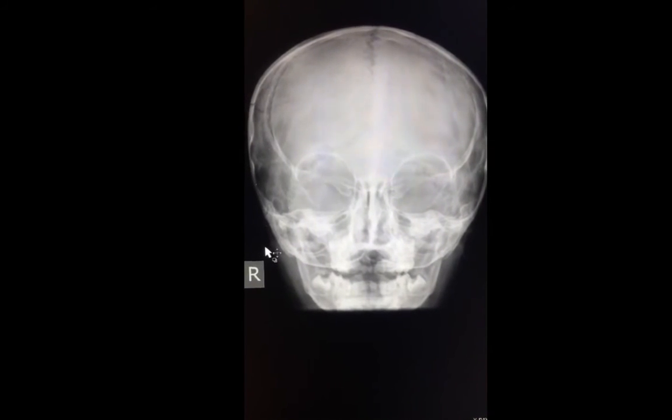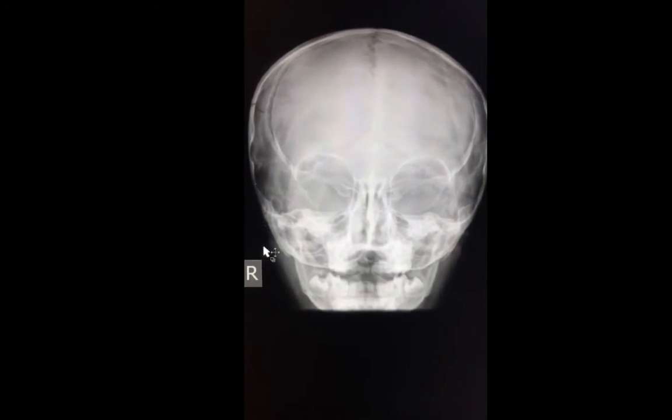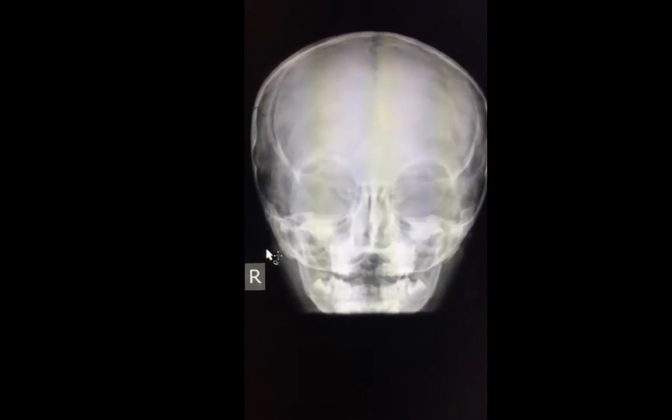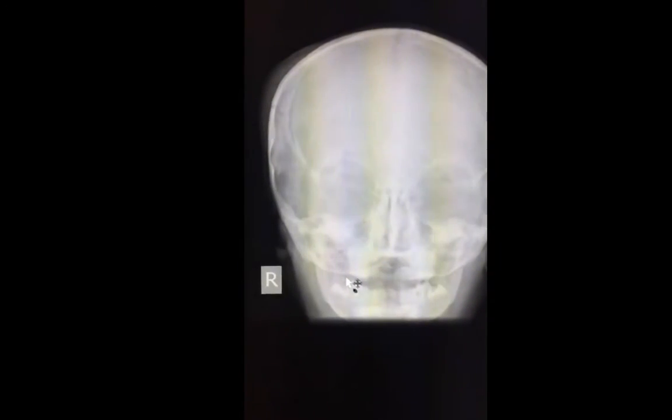In general, skull x-rays are not the easiest to read. With this provided clinical information, you'd like to exclude a fracture. Knowing the exact location of the head injury would make it easier to concentrate on the area of abnormality. So going into details about the history of the trauma would make it easier, but if that's not the case, try to change the window to assess where you have soft tissue swelling.